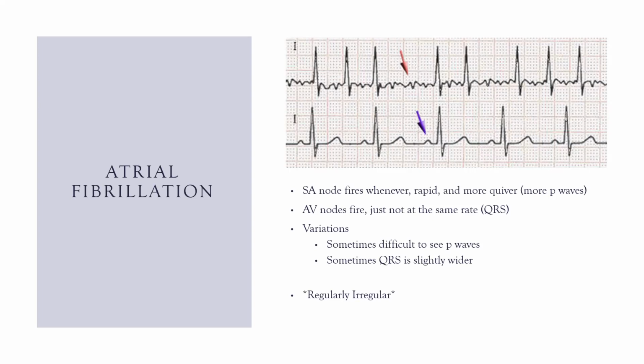It is also more of a quiver. So an atrial fibrillation is a quivering of the heart. There's no full contraction. It just kind of shakes and quivers and does its own thing. Now, that's not to mean that your patient will always have that quivering atria. Typically, right before a QRS complex, you will see what is a relatively normal, quote unquote normal, what's normal anyways, but you will see a relatively normal P wave. Does that happen in every atrial fibrillation? Heck no, but it does happen from time to time.